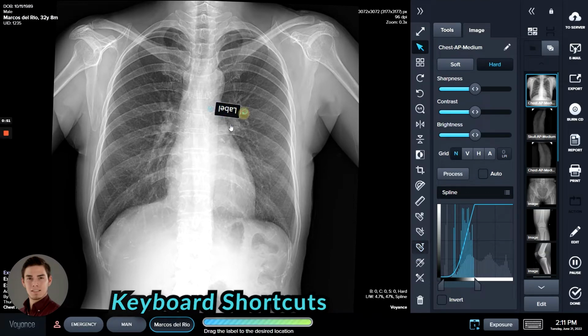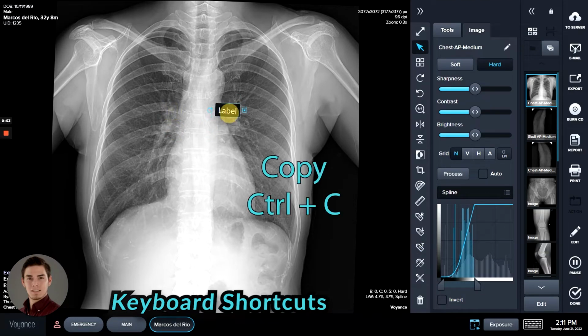One of the things that you can do also, Control C always works for copy, in case you want to grab some words. Control V will replace those words back. If you hit Control Z, that'll undo your last change, and it'll undo several changes prior to that.